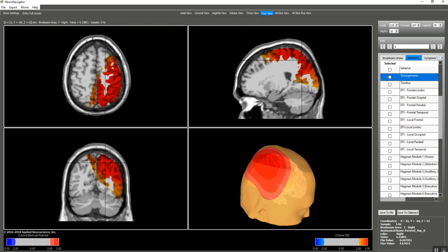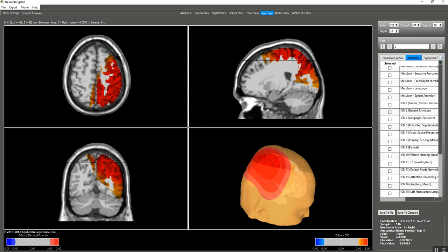And we'll be going through those in a second. Also the Hagmann hubs, there are 6 Hagmann hubs. They are in here as well, including the diffusion tensor imaging. And then the interconnectivity networks by the Human Brain Mapping Program published by Laird et al. in 2011. They summarized 30,000 PET scans and functional MRIs. Those are all in here.